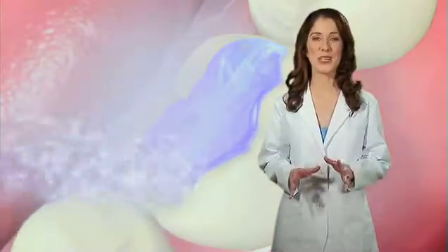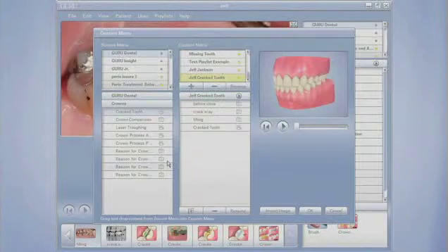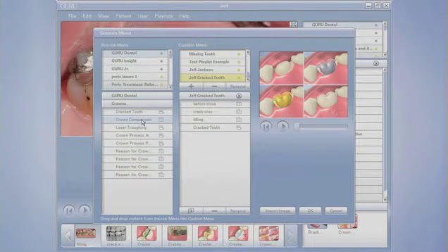The heart of Guru is over 200 original 3D animations and images, the highest quality, most patient-friendly teaching tools in dentistry. What was great about this is that we were able to customize this to our patients' individual needs. Your patients and my patients have different needs, but with 200 different animations, I can custom place those to tell that patient's story for whatever their needs may be at that time. And then you've got the added ability to drag and drop individual patient images, whether from an intraoral camera, an extraoral digital SLR, radiographs, all that kind of thing, and draw on those as well, and annotate them.